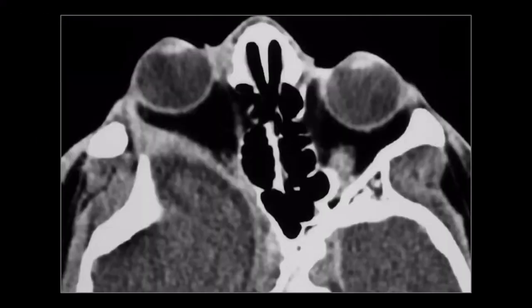Let's return to bony pathology. Something is off. This patient also has proptosis of the right eye, as you can see, and something is missing. Do you see what it is? Well, let's compare with the other side. What is this? This is the greater wing of the sphenoid bone, and it is completely absent on the other side. This is a sphenoid wing dysplasia, or in this case, even aplasia.